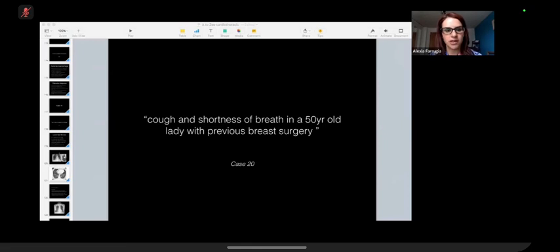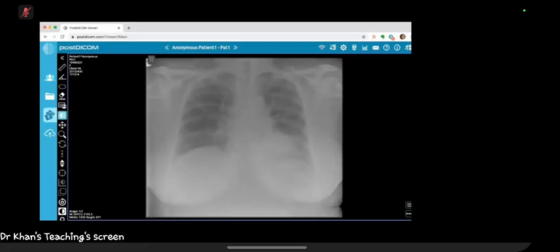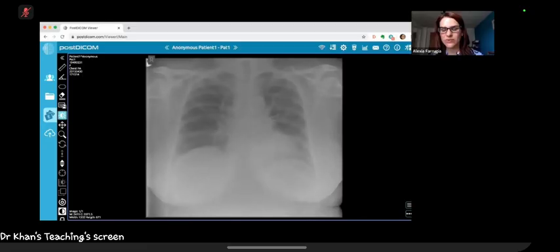We'll start with the chest X-ray, and then we'll move on to the CT. I'll window it for you because it doesn't project very well. Just talk through it, even if you don't see anything. Yeah. I'll show you a CT in a bit, so don't worry too much.